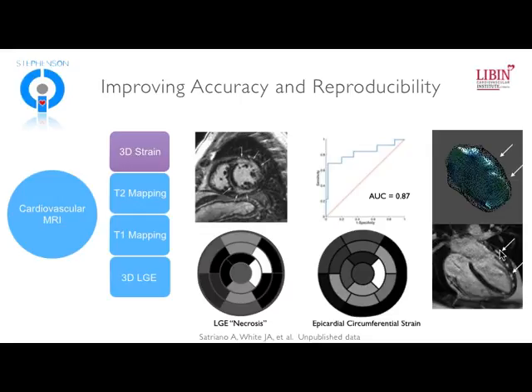So potential advantages of this process would be that you can track to see whether or not inflammation starting at the epicardial surface may be a more accurate marker of acute inflammatory cardiomyopathy.